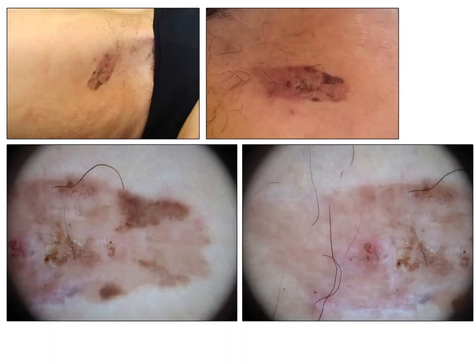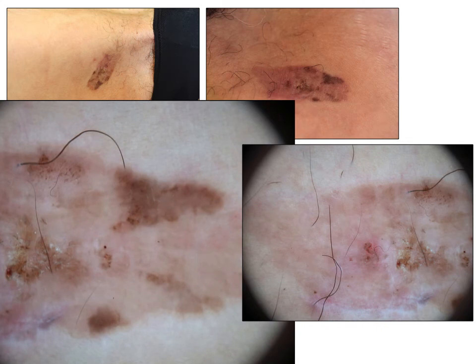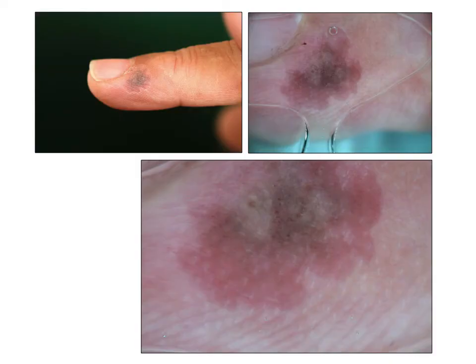In some cases also, we can observe pigmentation in Bowen's disease. This pigmentation has a very specific aspect on the edge with these lines of dots that are highly suggestive of Bowen's disease, especially in heavily pigmented patients. But pigmentation can also be irregular, like in this case of periungual Bowen's disease.